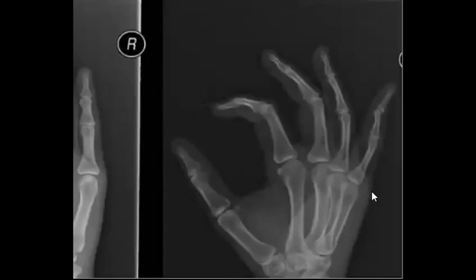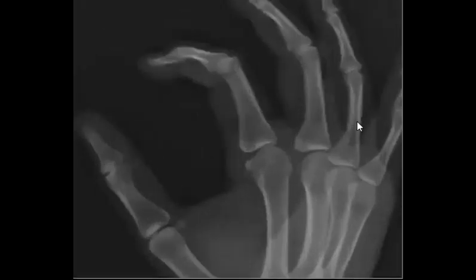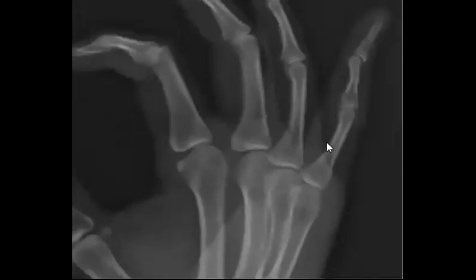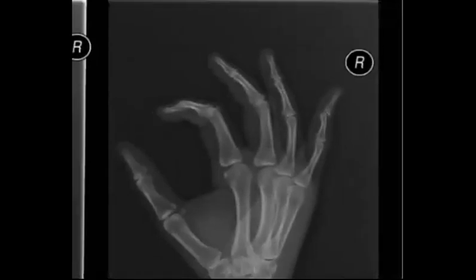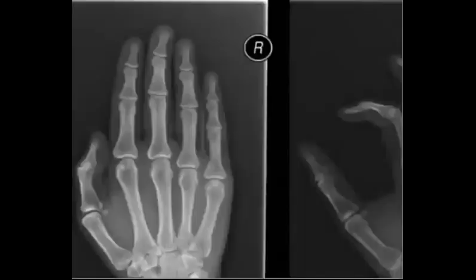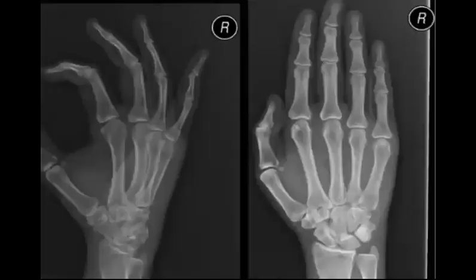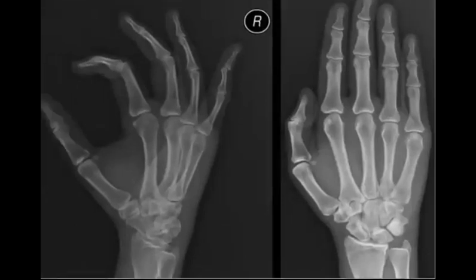So maybe if you are lucky, you can see the fragment, which is a very subtle fracture. But with some zooming, you can know that the fracture is in the little finger. It will take a while until you are used to it, but let's train here. So again, in the fifth finger, as in this case?